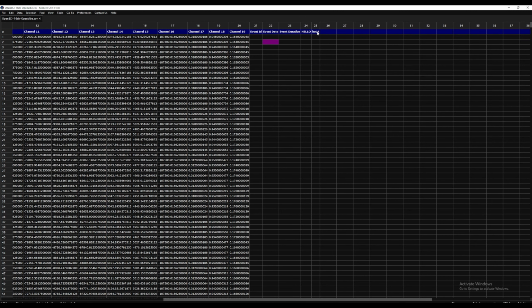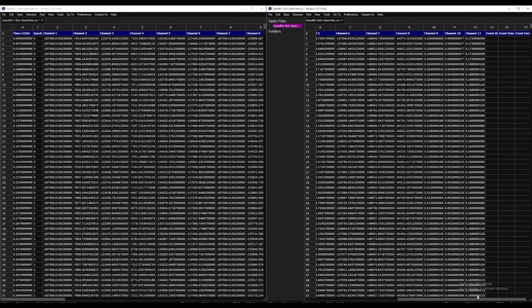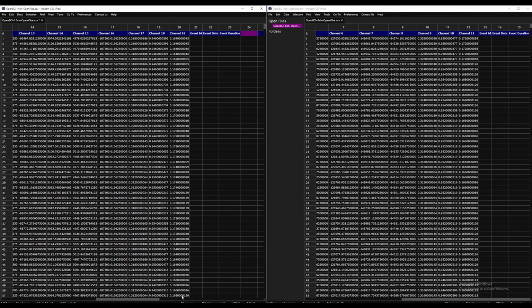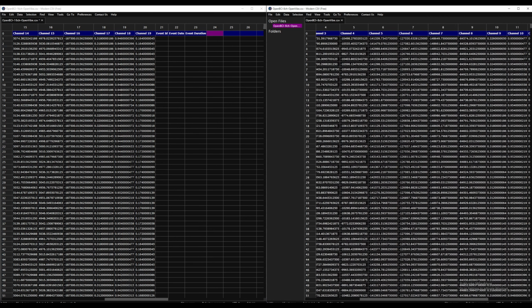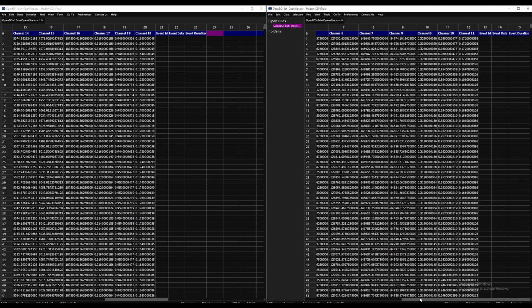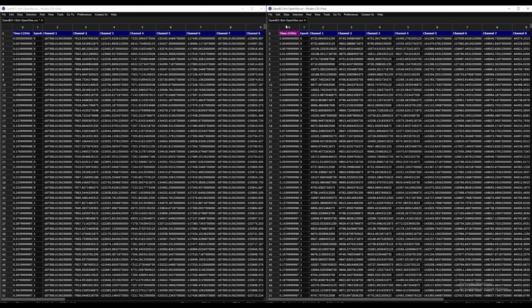All right. So let's read that. So you can see that other than the number of channels, the right-hand columns don't seem to be that much different. So one was 8 channels and 3 accelerometers. The other was 16 channel and 3 accelerometers. And they're really not that different at all. The only difference is in the first 2 columns, time and epoch.